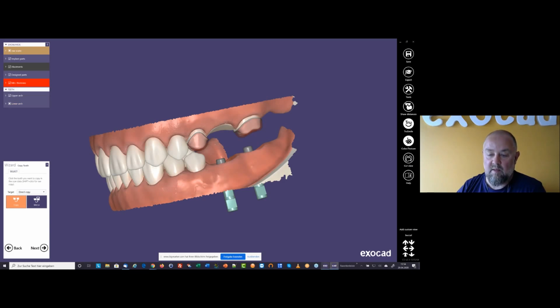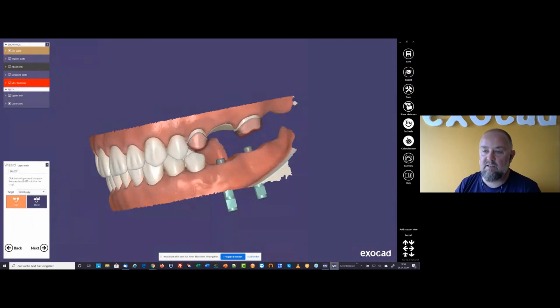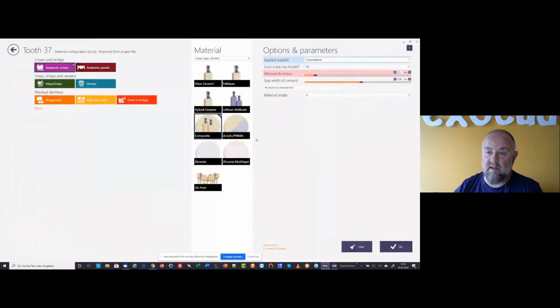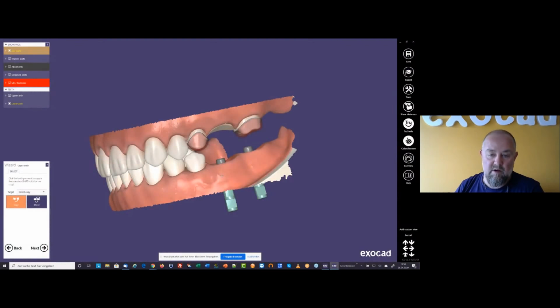And as I already said here in the beginning, if you choose the correct material, which can be provided by your manufacturing provider or by your milling center or whatever, they can give you a work params file which comes with all the materials they provide with the recommended parameters. Then you don't need to do anything here in this step. Of course, you can go into the expert mode, or you can change parameters here in the beginning. But compared to the lab version, you have a step where you can verify the steps again. But here it is simply skipped.